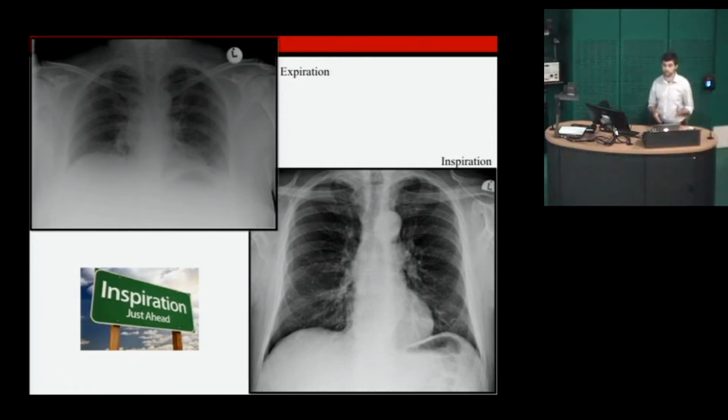So we've got 6 anterior. Do we all agree with that? Yeah? So between 5 and 7 is what is called normal, so call 6. And the anterior ribs, I think you can see it better on these ones, but it's so small. It's a pretty poor image, but there's 1, 2, 3, 4, 5. So I'd say 6 maybe anterior.